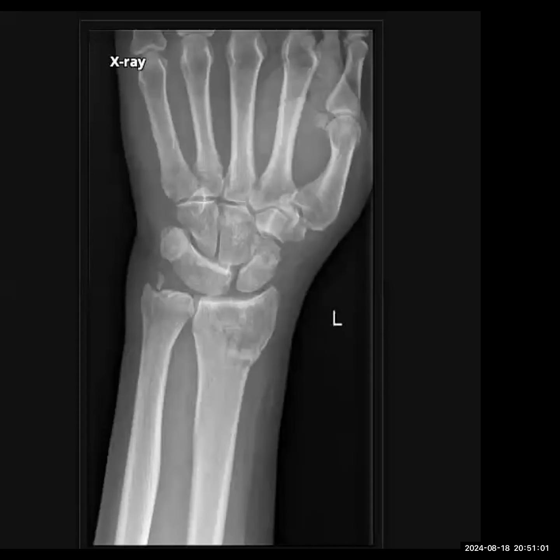I'm provided with the frontal radiograph of the hand and wrist joint in a skeletally mature patient. I'm going through my checklist. On first glance, I can see evidence of a fracture involving the distal radius, and also a fracture involving the styloid process of the ulna. There is no extension of this fracture into the articular surfaces. I can't quite appreciate whether there is dorsal or ventral dislocation of these fracture fragments.